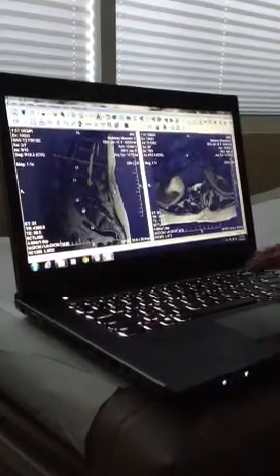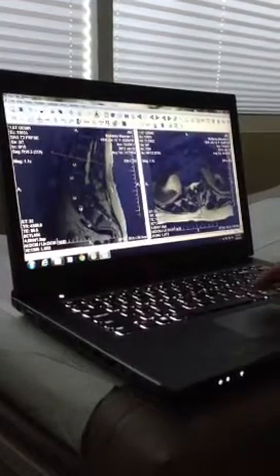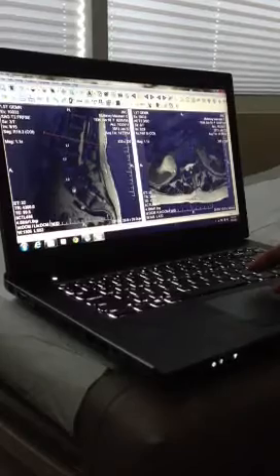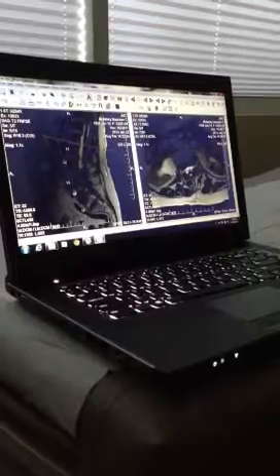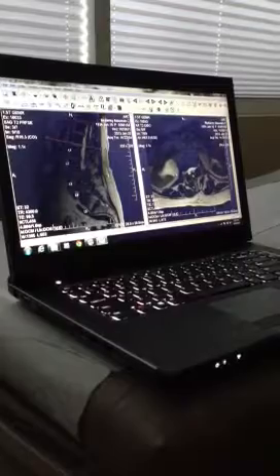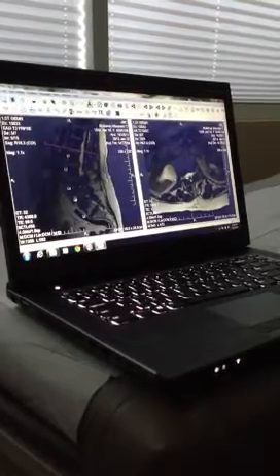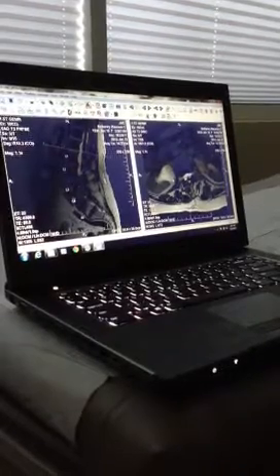One of the things that I see on your MRI, which is unrelated to your spine, is this over here. This looks to me like a renal cyst. Now, most people have cysts in their liver, their kidneys, and we just incidentally pick these up by getting an MRI. It doesn't mean it's cancer, doesn't mean it's anything bad, but it's something that I'm able to appreciate, not as a nephrologist or a urologist, and I would recommend that we bring it up to your primary care doctor and maybe just get a renal ultrasound.